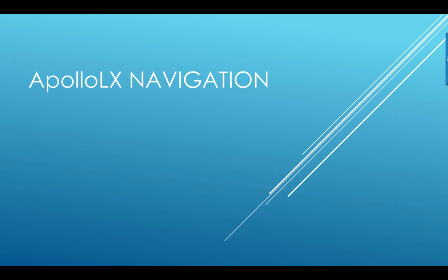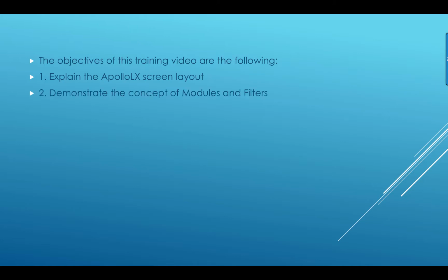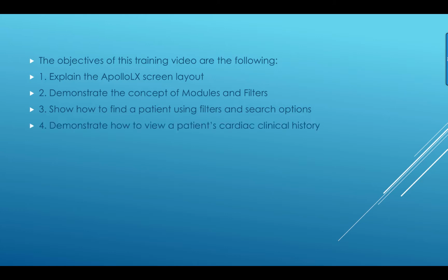ApolloLX Navigation. The objectives of this training video are the following. 1. Explain the ApolloLX screen layout. 2. Demonstrate the concept of modules and filters. 3. Show how to find a patient using filters and search options.